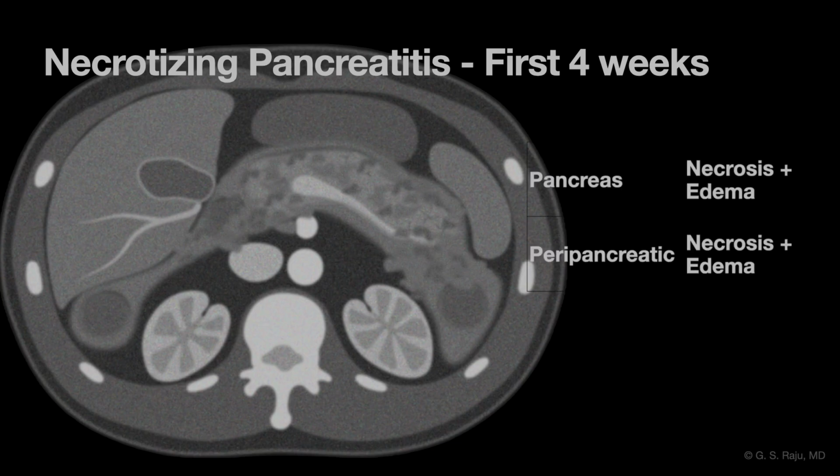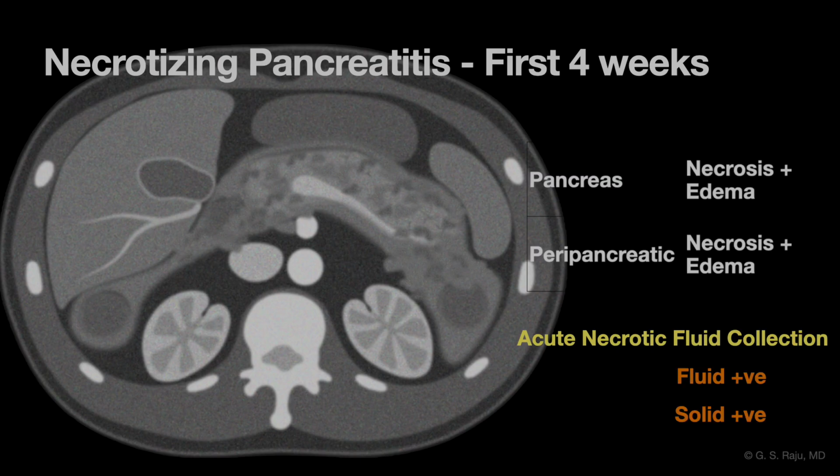And if the patient develops fluid collection in this setting, it will be acute necrotic fluid collection. In this case, you see fluid as well as solid necrosis.